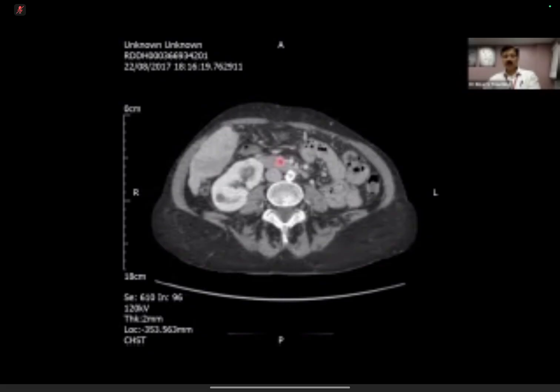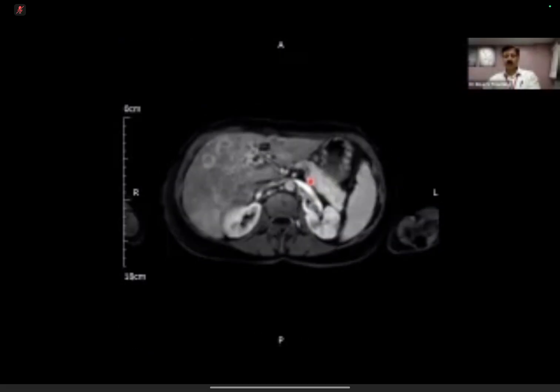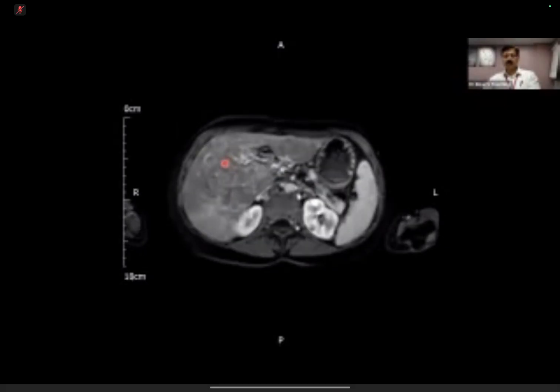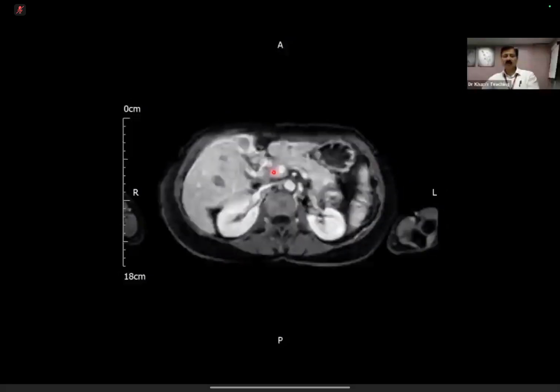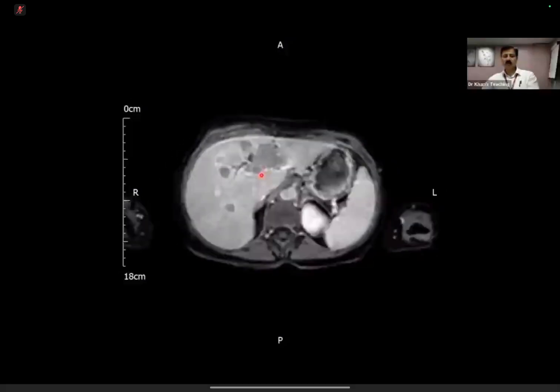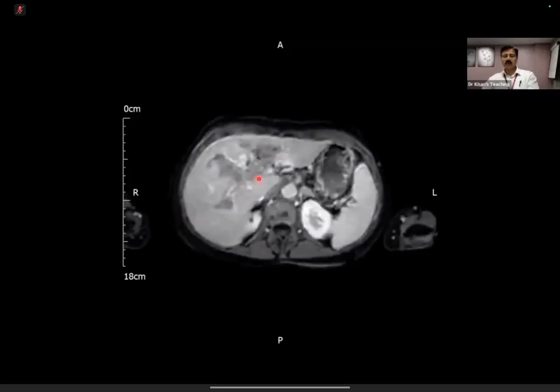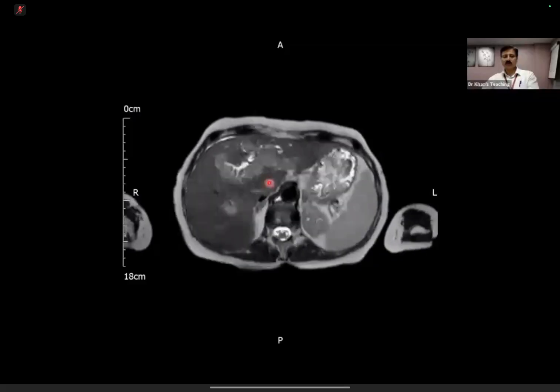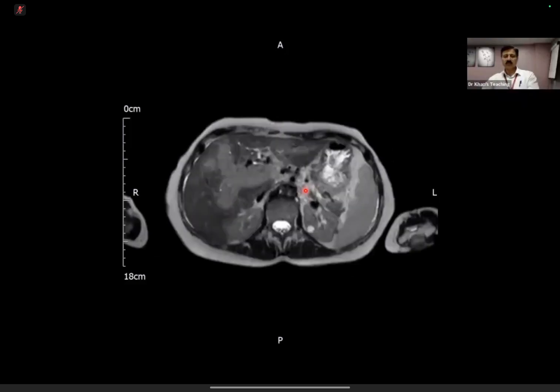But we have got a venous phase here, so we did not have an arterial phase. On arterial phase, there is a bit of enhancement here. But the key thing here, which I want to show you on venous phase, this is it. Again, you are not sure if there is tumor or whatever. And look at this, T2 is very good. It shows something is happening. But look at the diffusion. Diffusion was brilliant in this case.